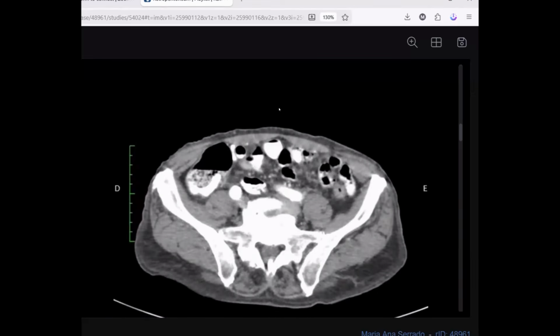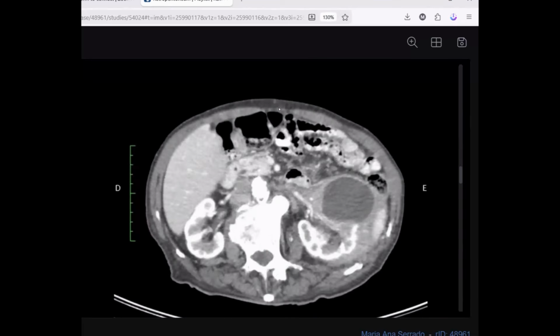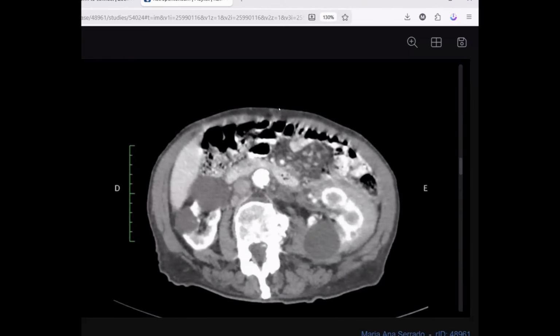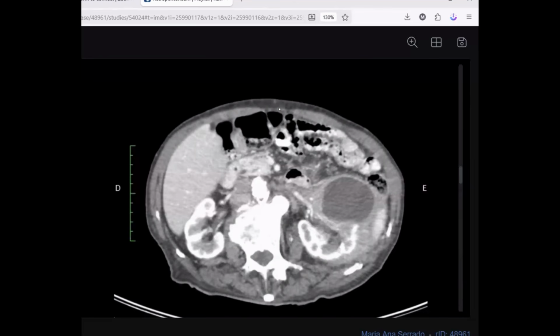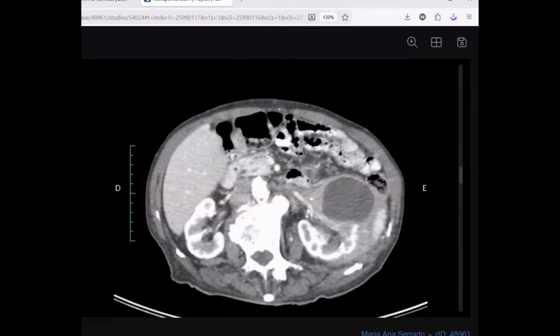So we have left perinephric soft tissue sheets, encircling the left kidney. Do you have anything more? Also thickening of the anterior Gerota's fascia and the posterior Zuckerkandel fascia, and thickening of the lateral conal fascia. In my routine practice, I like to see the coronal images to look for this. What's your differential diagnosis in this case, please?